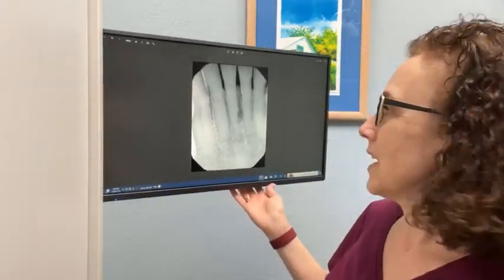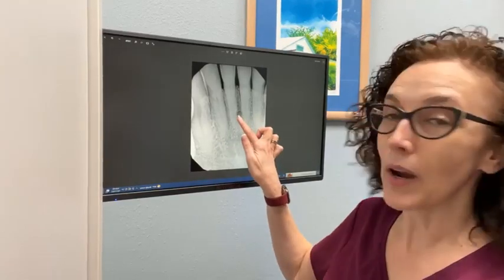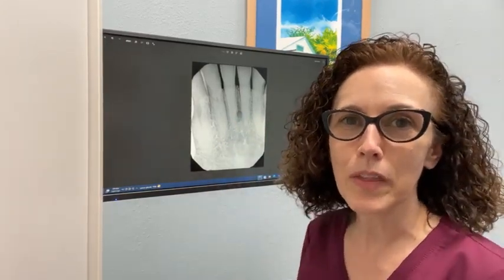So if you think of traditionally a CAT scan being taken on your body and being able to actually look at slices of it, it allows you to see the 3 different dimensions. So here's an x-ray. It's a 2-dimensional x-ray that was taken on a patient. And you can actually see right here, there's a little dark circle there in between the roots.